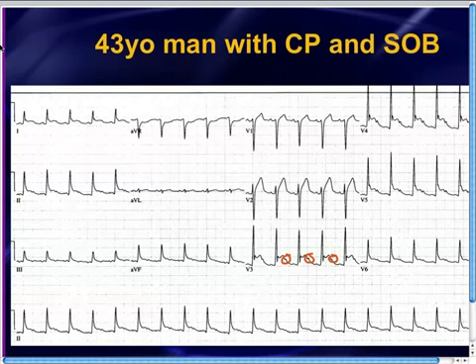And to be totally honest with you, I don't know what those are. Maybe the patient was twitching or something like that. But I'm not going to worry about it because they don't seem to be affecting the rhythm. And most importantly, they don't map out with the blips that we know are true P waves. Okay, so enough about the rhythm. This is just sinus tachycardia.